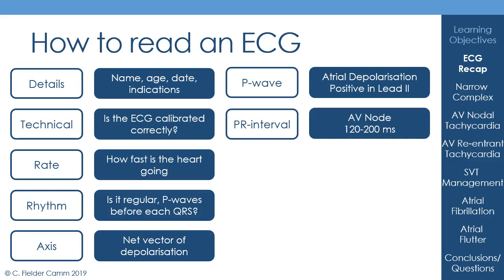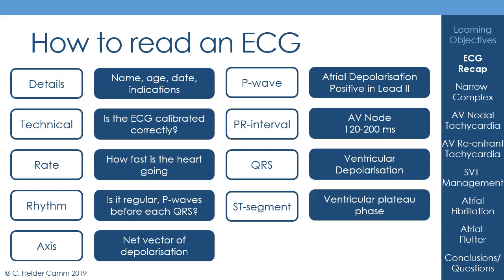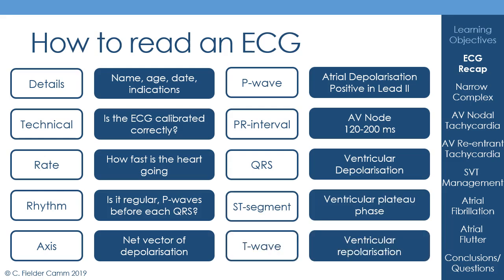Whether the PR interval is an appropriate length, what the QRS complex looks like, and particularly in this case we're going to be talking about whether it's broad or narrow, whether there's any change in the ST segment, and whether there's any inversion in the T waves.